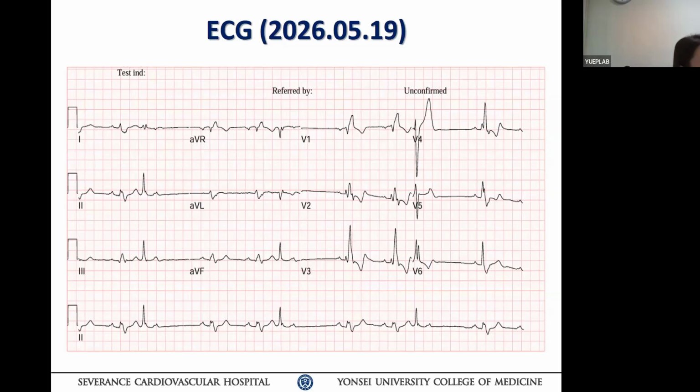Looks the same? Lead one, lead one. Does only one P wave, another P wave, that one. Same? You believe that? Overlap with T wave. Yes, but the question is, is there any other lead that can tell that? How about aVR? You see? What are the other P waves? The very last one, is it the same? You sure? I don't know now, because it overlaps. Okay, aVL. How about aVL? You think the same? Still?